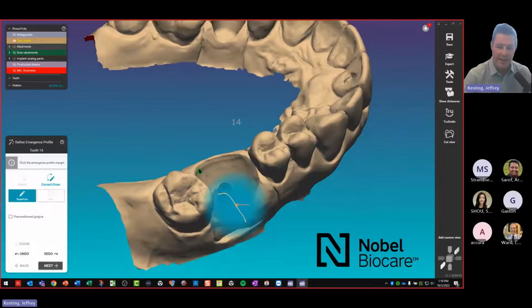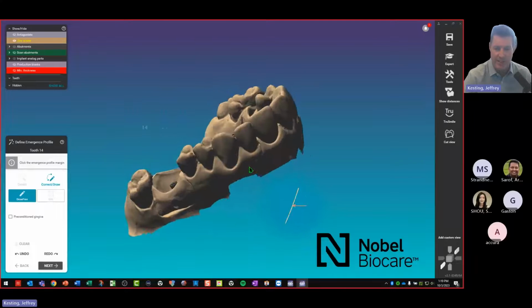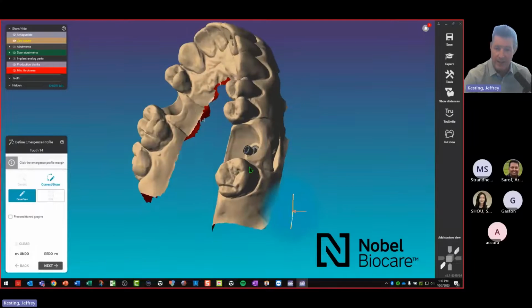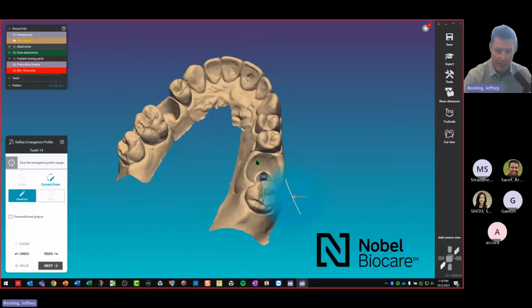And what you're looking at here now is the dental CAD software of exocad. So this is where you're going to be spending the majority of your time working on designing cases. Exocad does a wonderful job of bringing you through that. And it's what they call the wizard, which you see down here on the bottom left. And this is essentially a guide that brings you through the software so you know what to do next. You have the ability to jump to an expert mode where you have those tools and functionalities when you need them. But the wizard is a really nice workflow. Even experts in the software will probably still work through the wizard.